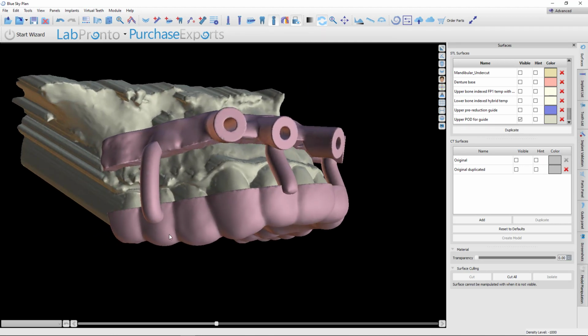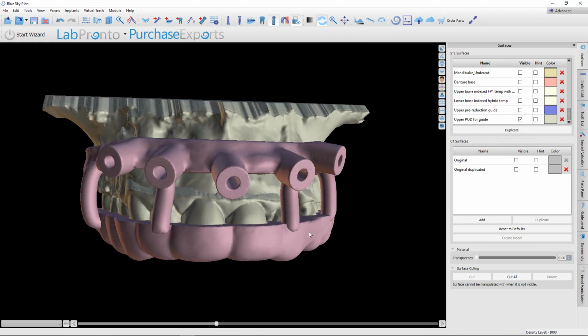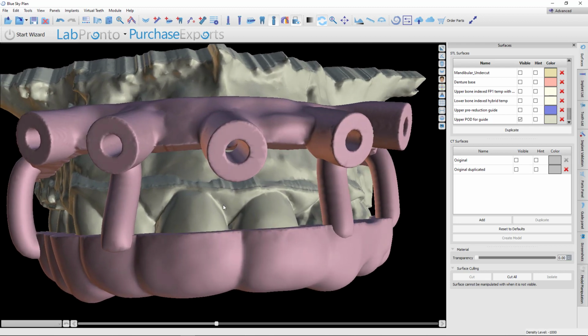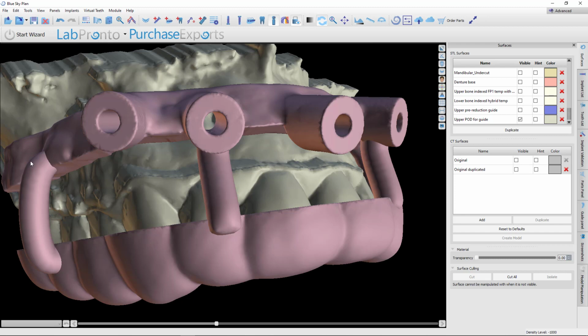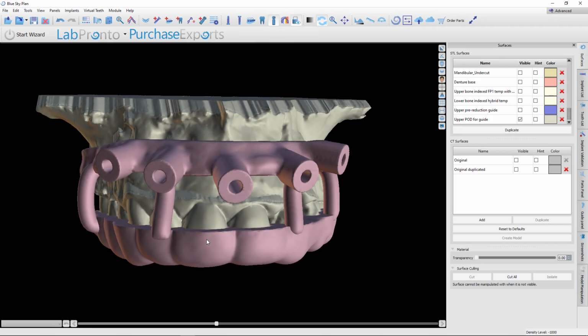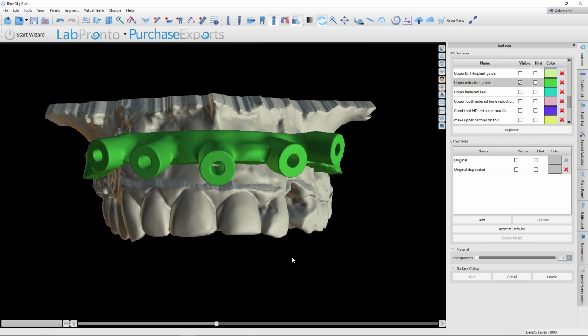I just connect these with some tubes in Meshmixer, and these are going to be sacrificial tubes. So carry this in, you would lay your flap and then put this guide on, position your reduction guide on the buccal bone, drill your pinholes, put the pins in, and then once that's done, you could just come in here and section each of these little sacrificial supports, and the whole indexing tray that fits on the teeth would fall away, leaving you just the standard reduction guide.